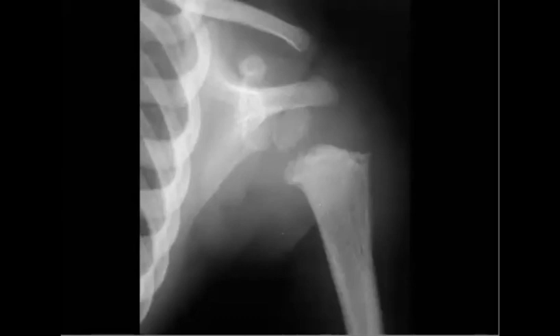Metaphyseal fracture. So what do you want to mention if it is a metaphyseal fracture? Non-accidental injury. Perfect. This is a very common case, and you like it in the exam. Metaphyseal is a highly specific corner fracture in the lateral aspect of the humeral metaphysis. So when you find it, you are talking about non-accidental injury, below 6 years, and most of them below 1 year.